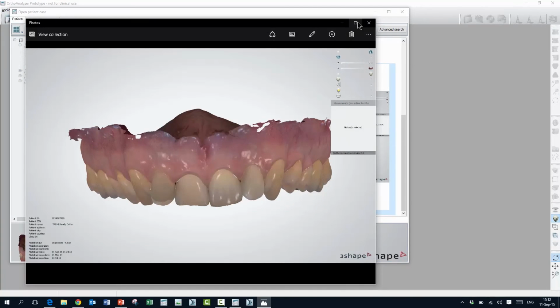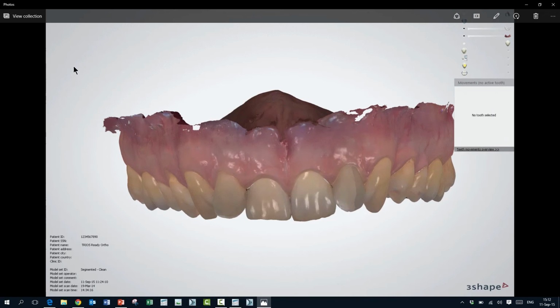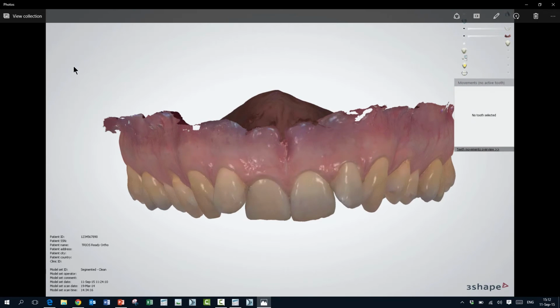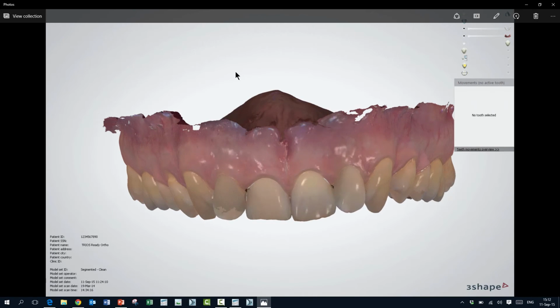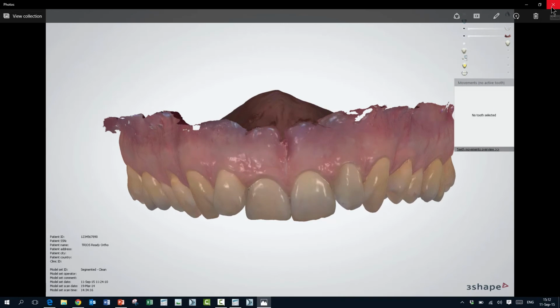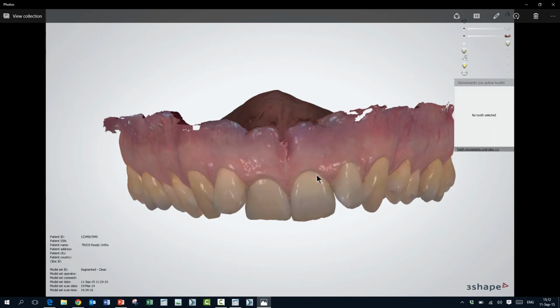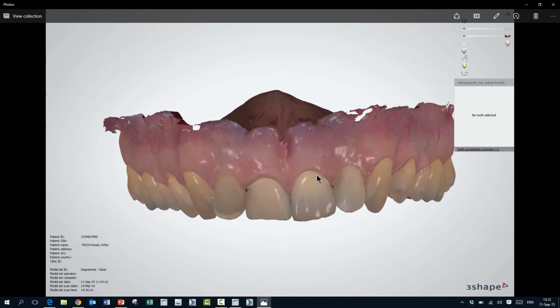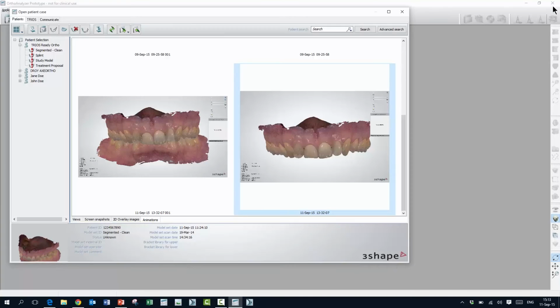I can even maximize it on the screen here. It shows exactly what you had on your screen when you generated the file. It's in real resolution, real color, as you can see. So a very nice experience. Let me just close it again. By the way, like a lot of GIF files out there, this is on continuous loop. So when you want to show this to your patient, you don't have to worry about whether you have time to show it or not. It will simply go on an indefinite loop. Let me close the file again.